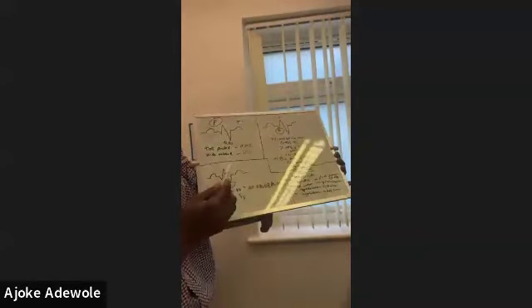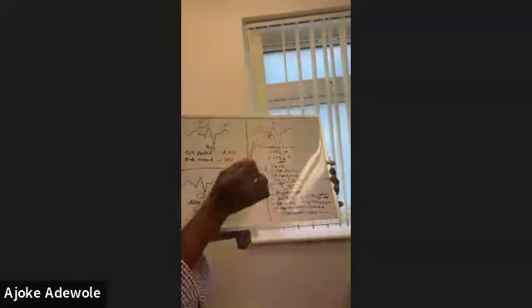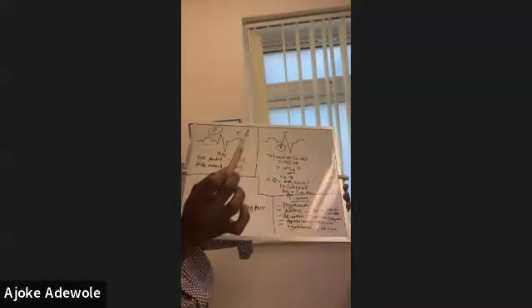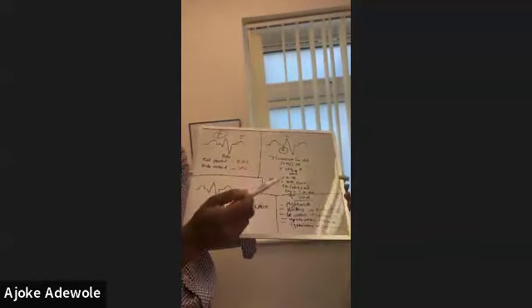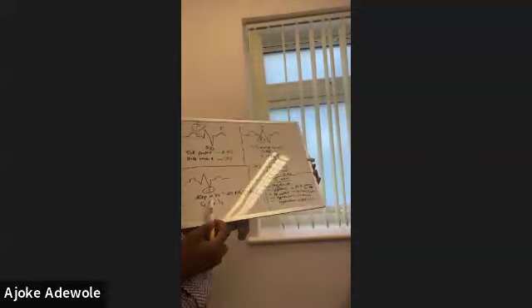And then the S wave. So this is your P, this is your Q, this is your R. Now, I didn't talk about your R wave, but I will do another training on that. I don't know why I omitted that. But your R wave is what is deflected up and your S wave goes down.